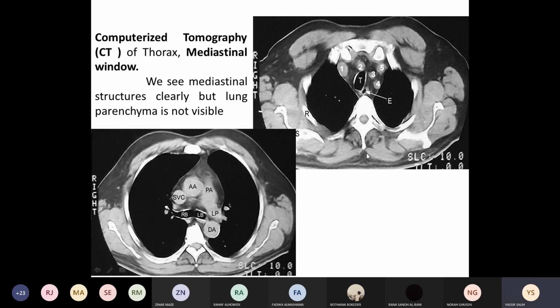هنا الآن تذكروا تماما أن this is the second block. يعني to differentiate between CT and MR لأن بعض الناس بيكون عندهم difficulty in differentiation. You have to look to the bone. This is axial section of the chest. لاحظوا إنه البون the bone لأنه containing calcium زي الإكس-راي بيكون very dense, very bright. But this is the CT.